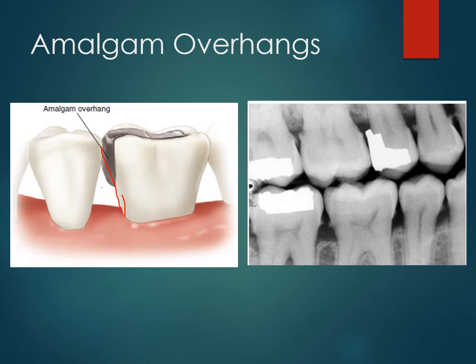And then they stick a little wedge here and it will hold the band right up tight against the tooth so that we have this perfect curved line. The shape of teeth is very important to their function, because if we don't have that curve along the side of the tooth that narrows down, when you eat, food comes down into this area and gets caught in this space down here, and we don't want that.